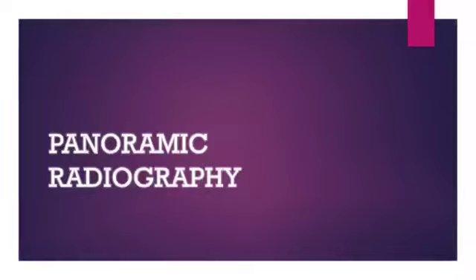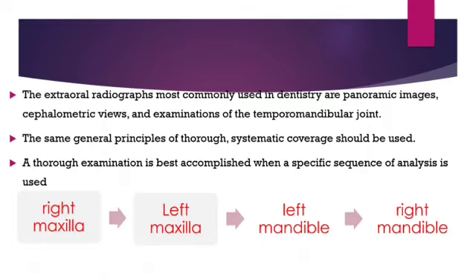This class is on panoramic radiography and its anatomical landmarks. The extraoral radiographs most commonly used in dentistry are panoramic images, cephalometric views, and examination of TMJ. The same general principle of thorough, systematic coverage should be used. The thorough examination is best accomplished when a specific sequence of analysis is used.